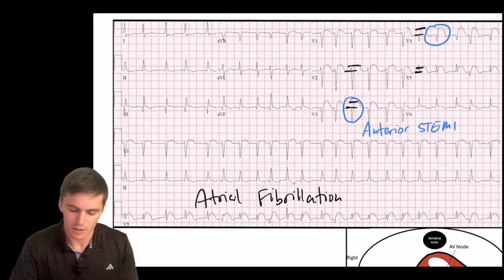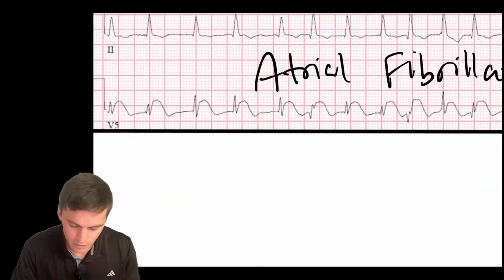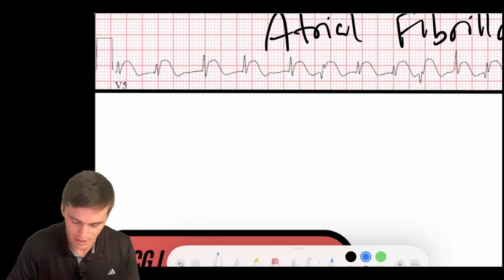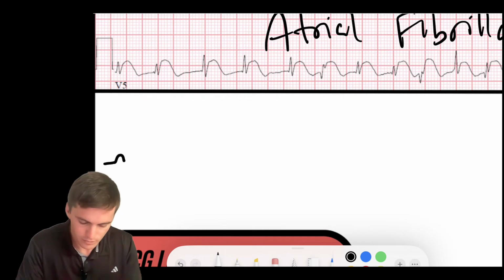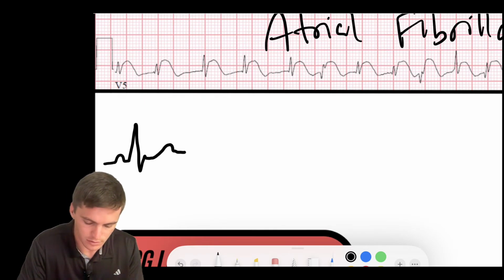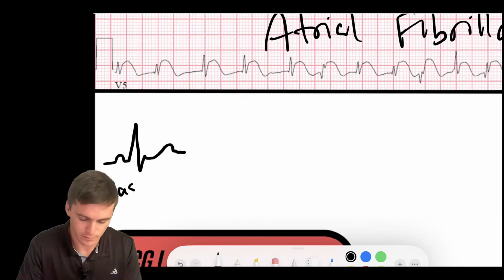As an example of how we would expect for the ST segments to change over time, okay? So initially, this is kind of the flow of ST segment changes with time, right? So we have our baseline normal EKG, which is like this, right? Normally you have a P wave, QRS, and a T wave. That's our baseline, okay?